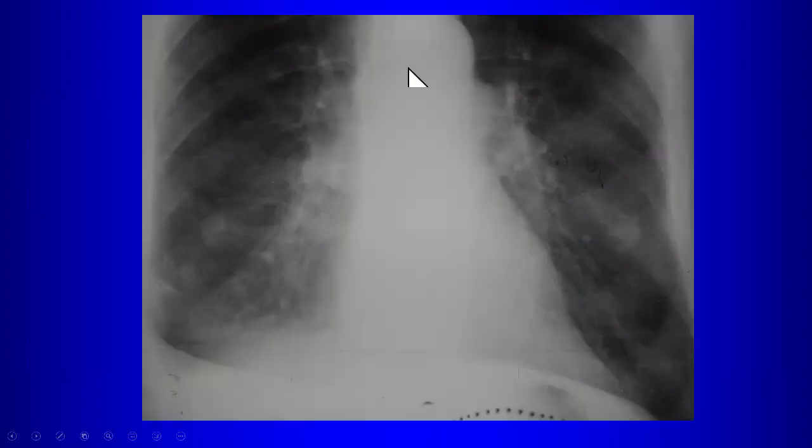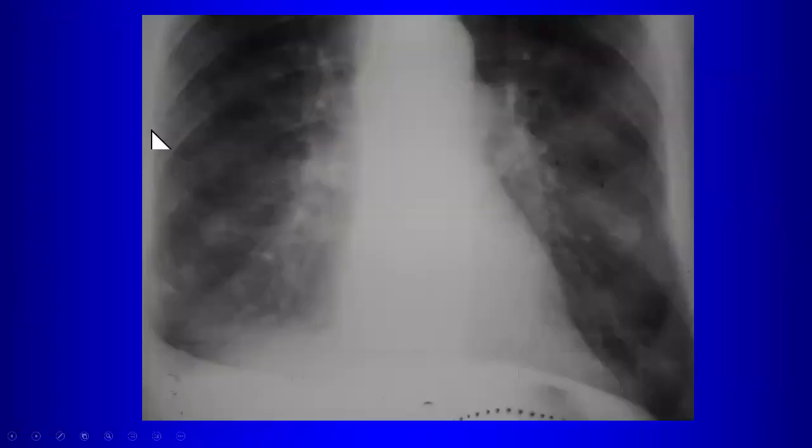All right. Okay, so we have another case of a person with these ill-defined nodular opacities here. And if I show you these images on the same person, what are we thinking about? Whereabouts? Like in the soft tissue? Yeah, so these are in the soft tissues, right? So these are not nodules actually in the lung, even though they look like they might be in the lung when you look at the chest radiograph, right? So these are actually soft tissue nodules.